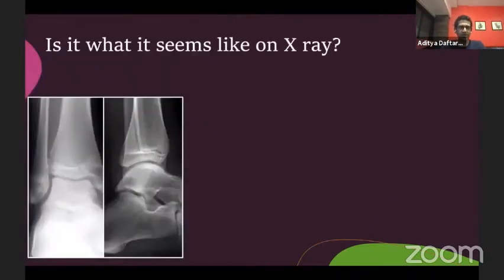So let's take a look at this example of a patient who is a young child who has a fracture that goes through the distal tibial epiphysis. And when we look at this fracture, the question is, what runs through our head? The first thing that runs through our head is, is this a juvenile Tillaux fracture, or is this a triplane fracture? We see this line running up the back, and we see this thing here, and we're not really entirely convinced which category it falls into.